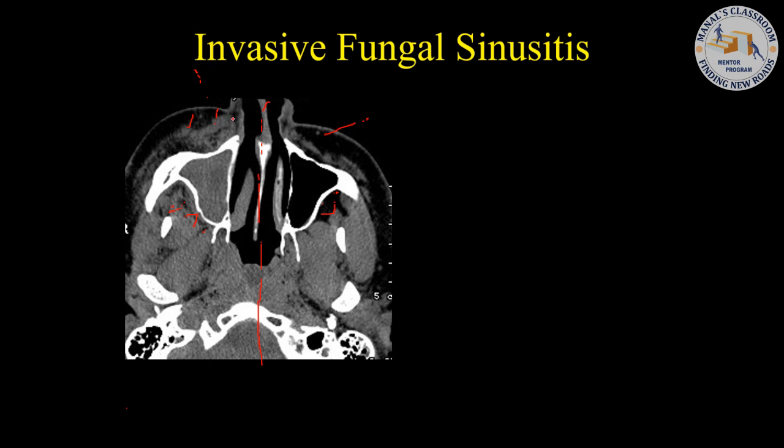See the canine fossa here? See this disease? And compared to the opposite side, there's no disease. That's the earliest findings of invasive fungal sinusitis. That's where you can make a difference.